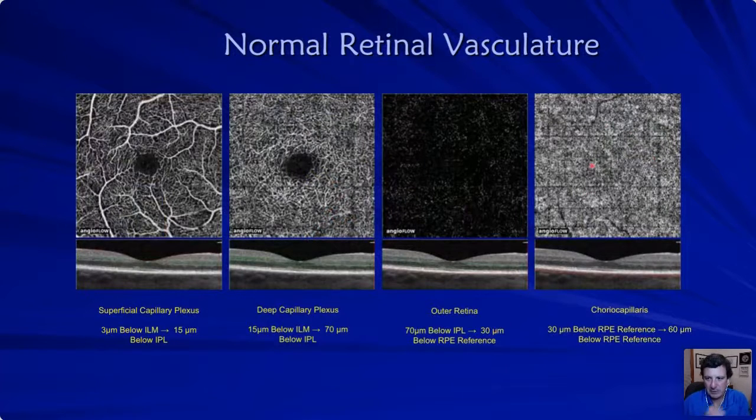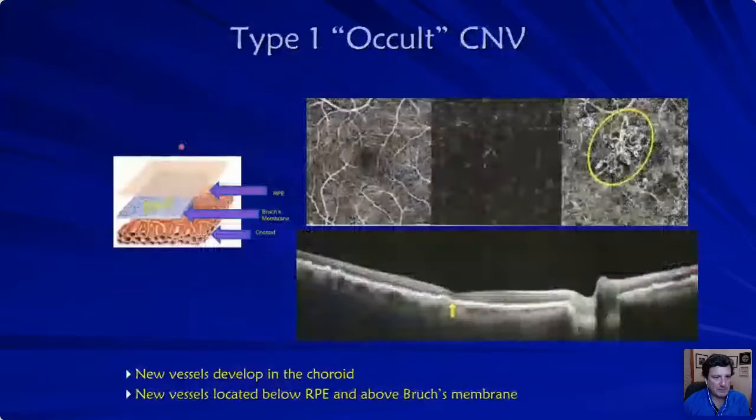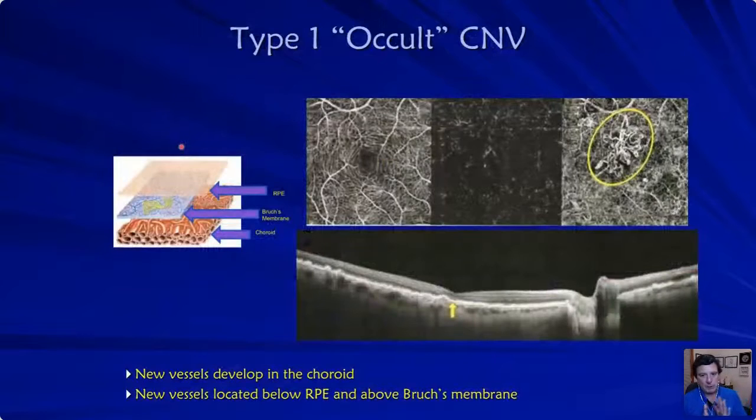I always like starting by looking at the choriocapillaris, coming up, making sure it's a sea of white, then a sea of black, because there should be no photoreceptors there, or no blood vessels there. It's all photoreceptors, sorry. Should be all photoreceptors, just no blood vessels. Deep capillary plexus, and then the superficial plexus. And this is what's really, really been cool with macular degeneration.